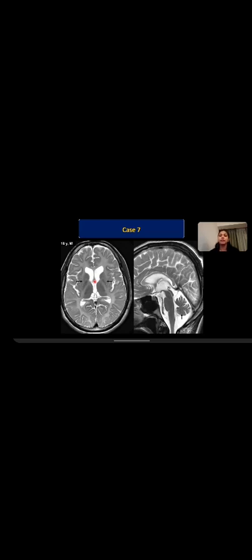These patients usually present with dystonias, apart from the features of hypomyelinating leukodystrophies, and the dystonias are more predominant as compared to the other features in these patients. Apart from this structure, there is also something here. So there is cerebellar atrophy. In addition to cerebellar atrophy, what do we see in the basal ganglia? Do you see any signal changes or any volume loss? So there is very significant atrophy of the basal ganglia.